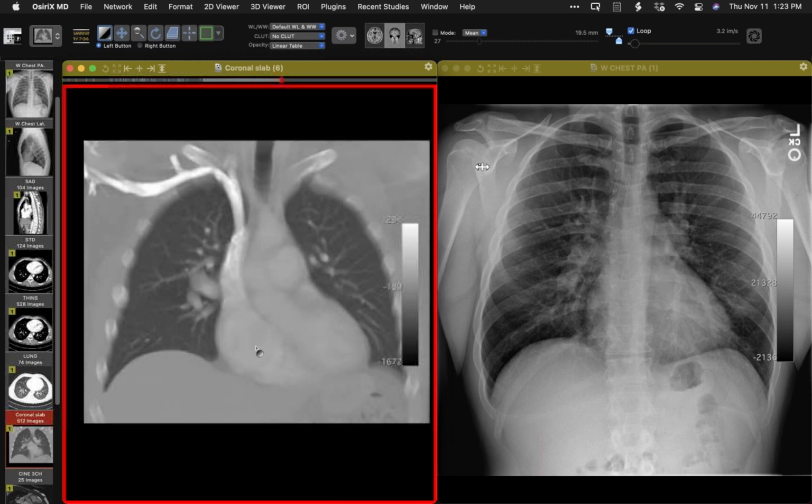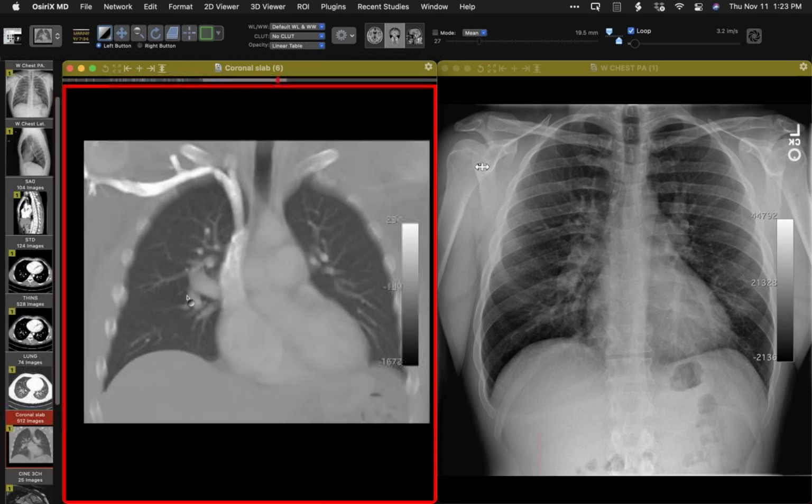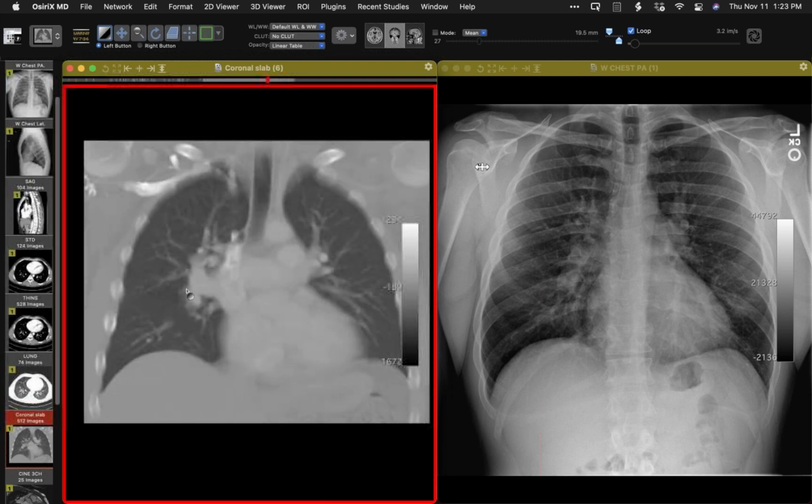But as we scroll through this, bingo, at least on the CT, of course I'm thinking ahead, we see a distended vein here, rather distended, and there it goes towards the SVC right there. So we are beginning to be able to diagnose PAPVR involving the right upper lobe, and of course the association between that and sinus venosus-type ASD. He had a workup. His MRI showed a QP to QS ratio of 3.2, a substantial shunt.